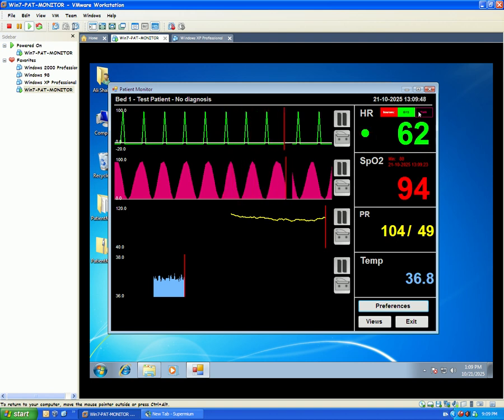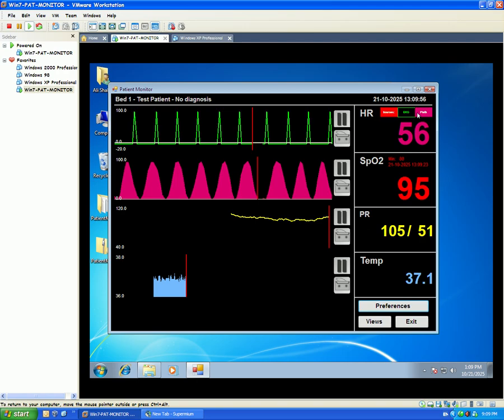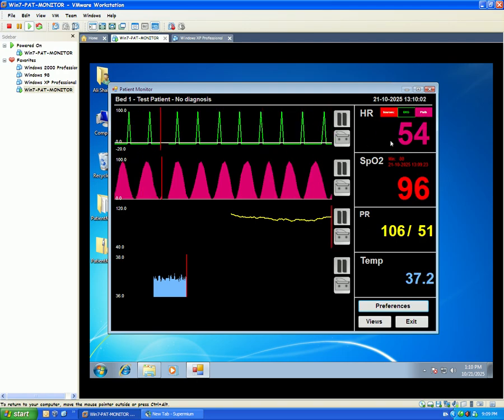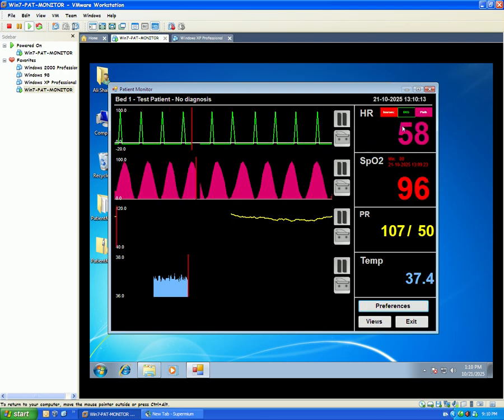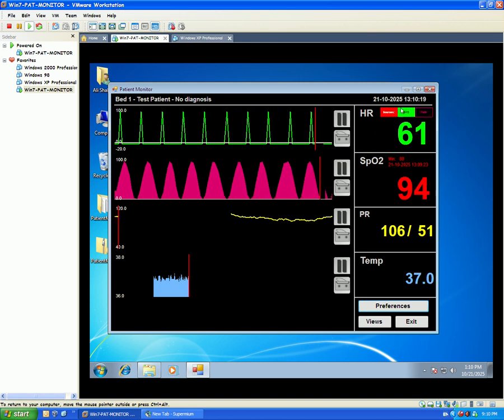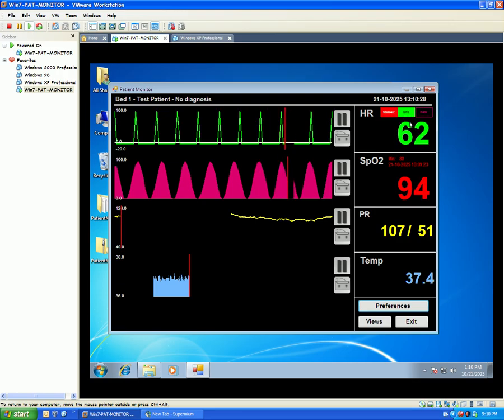Now, one thing I cannot forget to show you is that you can enable the pleth. Look, this number changes and it's 57, 54, 53 BPM for the pleth rate, and the EKG I'll show you is 61, and it's back to the green one. If I press on pleth, it changes to purple, and it changes to green when I switch to EKG.